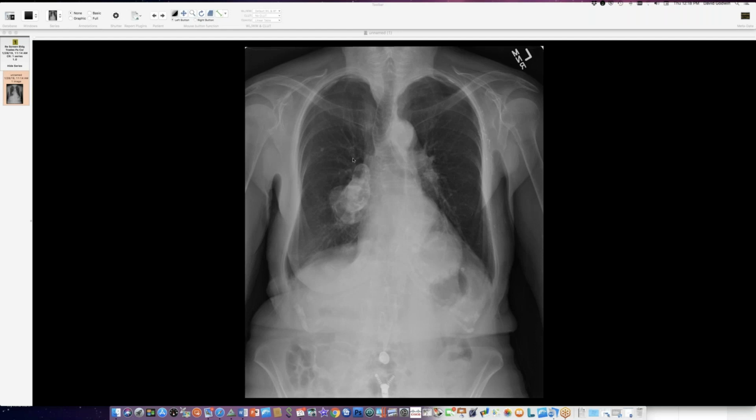So I believe that this is the sort of thing that Jeff has shown before, of these massive calcified lymph nodes in the setting of histoplasmosis. Here's another granuloma up here, by the way. So Jeff, you've shown stuff like this, as I recall. Is that right? I have a case of exuberant calcified lymph nodes, milk of calcium, which I suspect this probably has. It's rare to get them this big, but it does happen, because in acute histo, we've seen patients with pretty fat nodes.